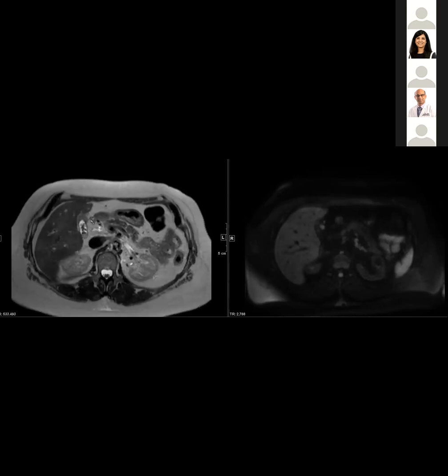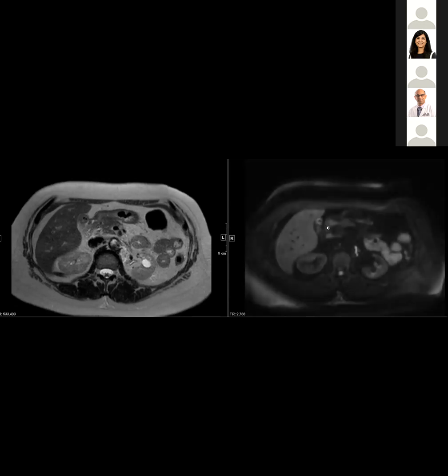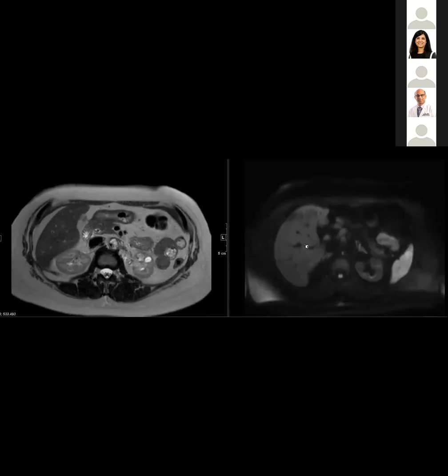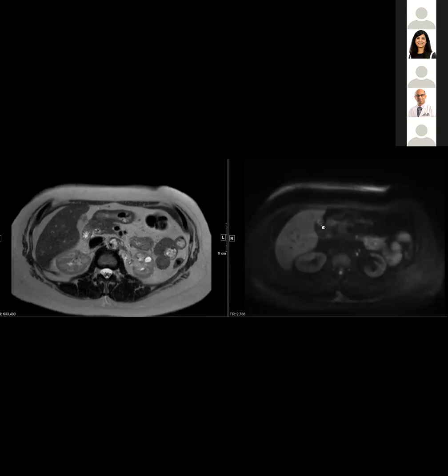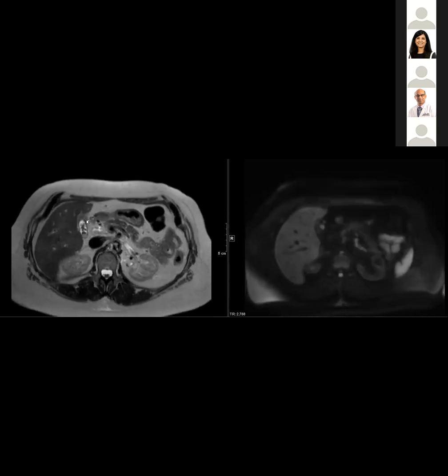So the patient had to go back and get a wider resection afterwards, and they're trying to figure out if she needs chemo. Is there a node or some deposit near the fundus on diffusion? Okay, can you say that again? Is there a node or a deposit in one of those images? Yeah, go back on the diffusion. Right there. One more. The other way. This? One more. Yeah, that one. No, this was part of the thing.